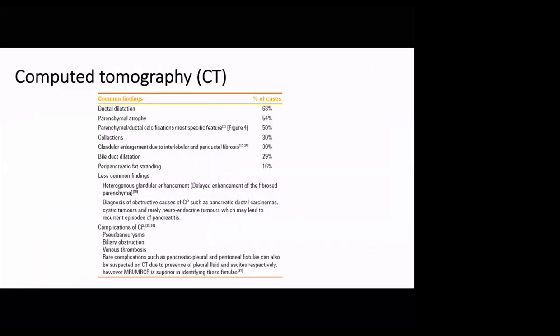هذا ملخص للفيتشرز اللي ممكن نشوفها بالCT scan.